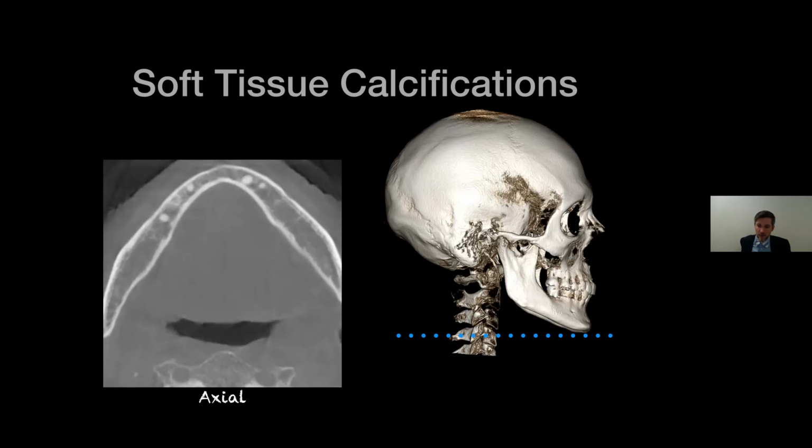I don't have the literature in front of me to give you an exact percentage, but any pan, even with a perfectly positioned patient, will have at least around 20% magnification. I would not diagnose or use a pan for exact measurements. The beauty of cone beam is the measurements are anatomically accurate, 1-to-1.